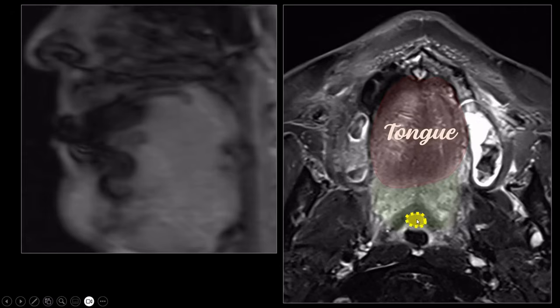We can recognize here the uvula. We even see these muscular structures. And this is probably the Levator veli palatini, or is going to be the Levator veli palatini. And then we have tissue with different signal characteristics. So this is the non-muscular tissue of the soft palate.